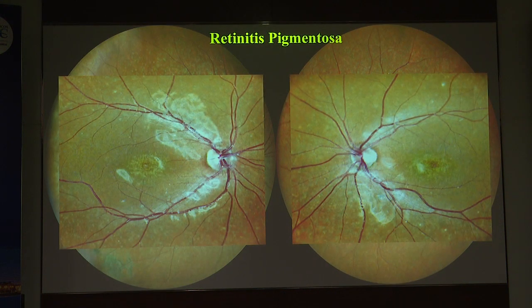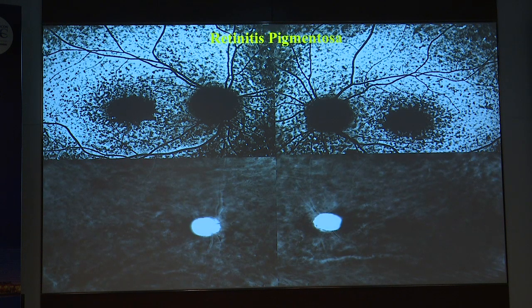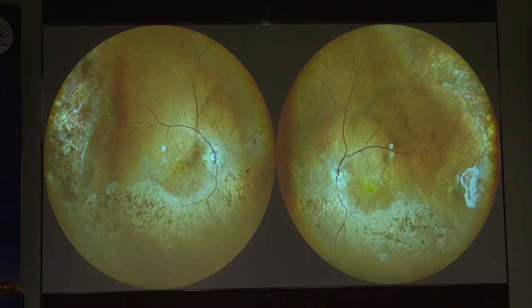Now let us see how it looks in diseases which affect the retina. In a macula, this is a case of typical retinitis pigmentosa. This is the color photo. This is the FAF of that particular patient. The disc is black, correct? Now look at this. You will see multiple bubble-like RPE changes here. It will become more pronounced in the consecutive cases which I show you. In retinitis pigmentosa, RPE is not the seat of the disease, and therefore here the RPE is not affected much.